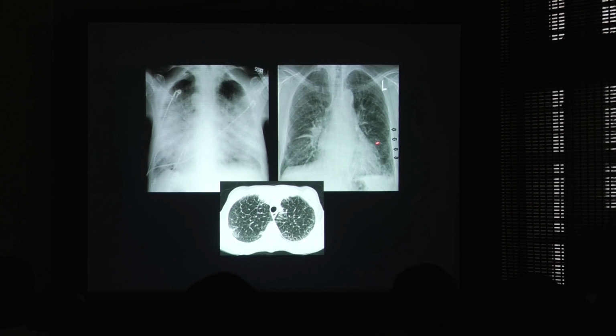So for that, you have to look at the periphery of the lung, towards the pleural surface periphery in the lower lobe region. If you look carefully in your image, you can see thin linear lines which are 1 to 2 centimeter long, which are perpendicular to the pleural surface. They are known as Kerley B lines. And these lines are due to fluid filling the interstitium, that is the interlobular interstitium.